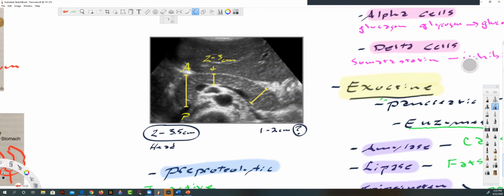All right. Oh, and we've got something else going on here. Let's give it a green color. I've got to draw it in since we can't see it. That's pretty normal. We can't see the duct of Wirsung here and the accessory duct there. I guess I could have used a different color, but it is what it is now. And let's use yellow again. No, let's use orange because we want to differentiate this a little bit.